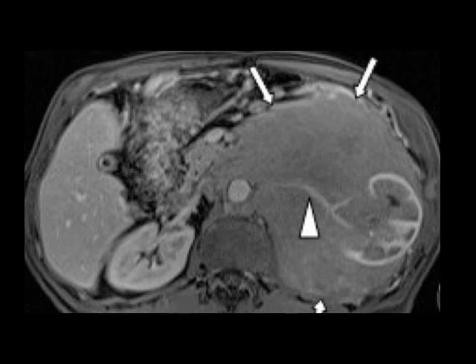A characteristic finding to show you that it's lymphoma is that the renal arteries, although surrounded by the lymphomatous mass, will often remain patent. So patent arteries and vessels, even though they're encased by tumour, is characteristic of lymphoma. Thirdly, you can often see hydronephrosis. Remember, the mass invades the renal hilum and compresses the collecting system. So hydronephrosis is common. And finally, renal displacement that you can see here is also very common. So these are the main features of pattern 3, which is contiguous extension from retroperitoneal disease.